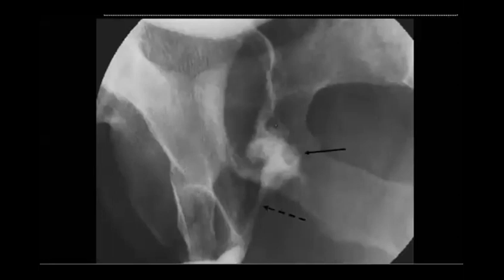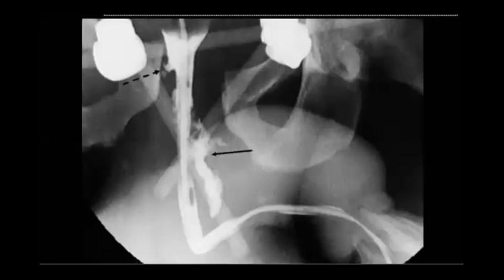Okay, and it should be superior to the urogenital diaphragm, so it is type 2. To be honest, in the exam it is not very detailed like this. I mean, they don't ask about the classifications, but okay, let's have a look.